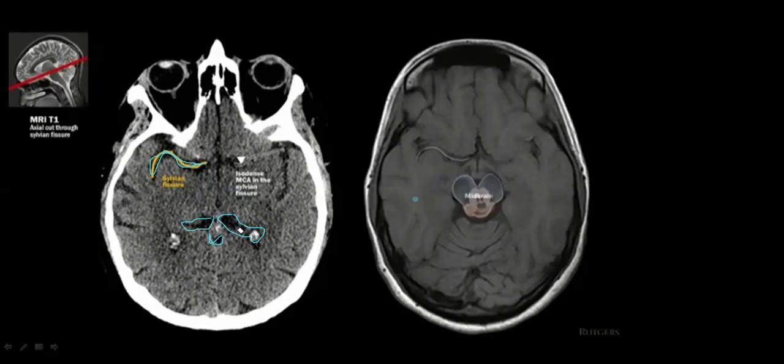Okay, only one structure is there, that is the Sylvian fissure. And posteriorly, we see the level of midbrain. Okay, and what about it? And this is the choroid plexus. This one, ventricle. And what about it? This is not a fourth ventricle. This never could be a fourth ventricle.